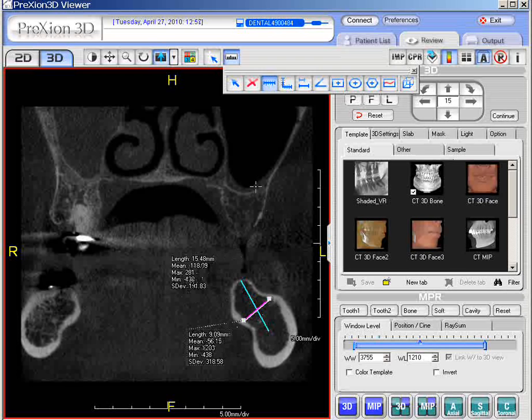To delete these, the quick way is if you right-click it and just hit delete, the numbers in the line will go away. The other method is if you come across to this red X as a delete, you can left-click it, drag down to the numbers, point the arrow anywhere in the number field, left-click, and it will be released.